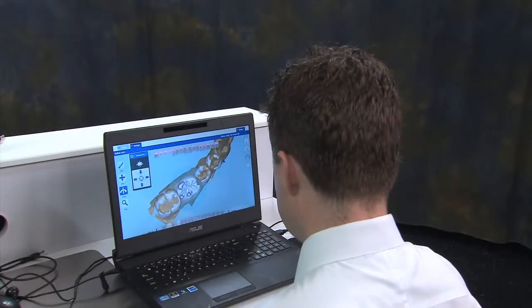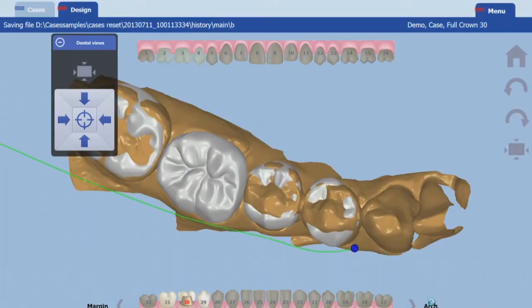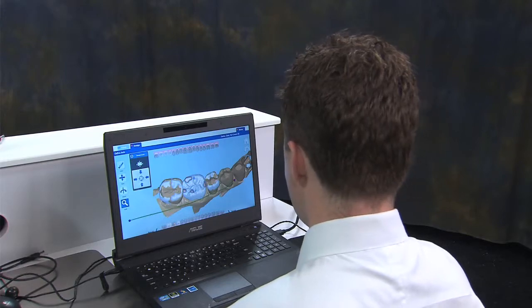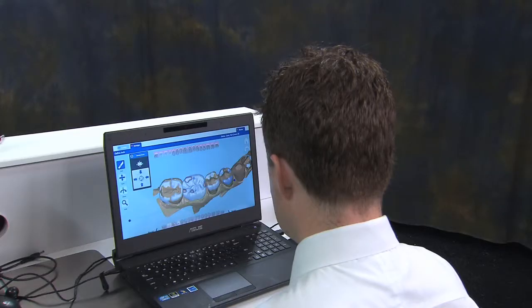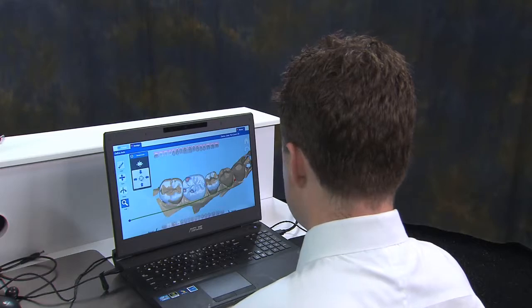This is where we overlay our crown library over the patient's arch to give you an excellent proposal. The software does most of the work by choosing from hundreds of thousands of examples for each tooth and picking the design best suited for the tooth, allowing you to simply approve the proposal. With good scans, this page will be skipped a majority of the time.